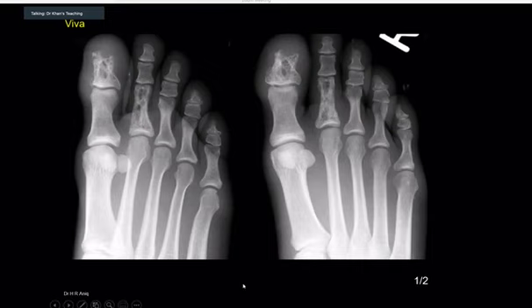Excellent. Now, this is a pathognomonic case of sarcoidosis. Sarcoidosis has come in the exam many a time. And please remember that this can also come as a long case, for example, with some finding on a chest X-ray or a CT of the chest. Sarcoidosis is a whole body disease, even neuro or head and neck, and so many manifestations are there. But in the bone, there are many, many patterns which can happen.